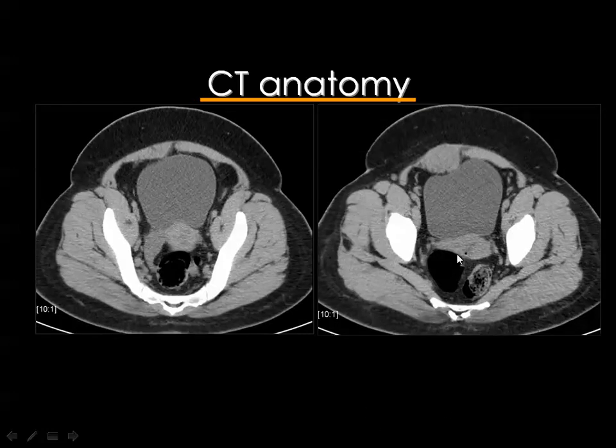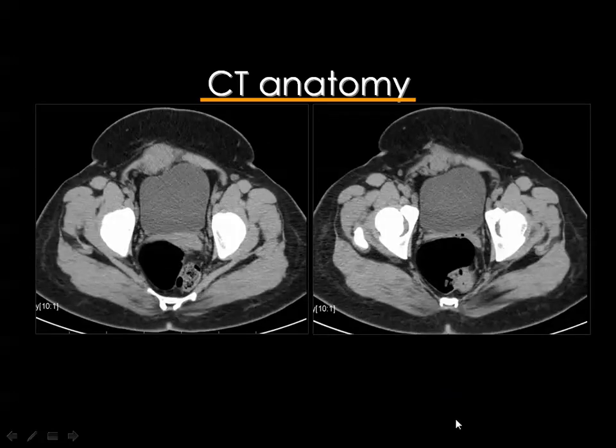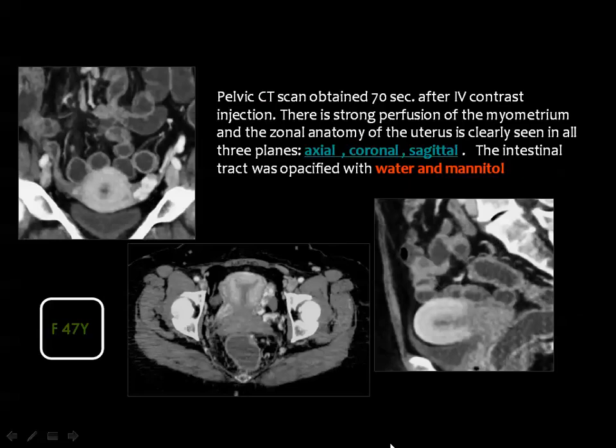And lower down you reach the vaginal vault. This is the urinary bladder and the rectum. And here is the vault of the vagina.